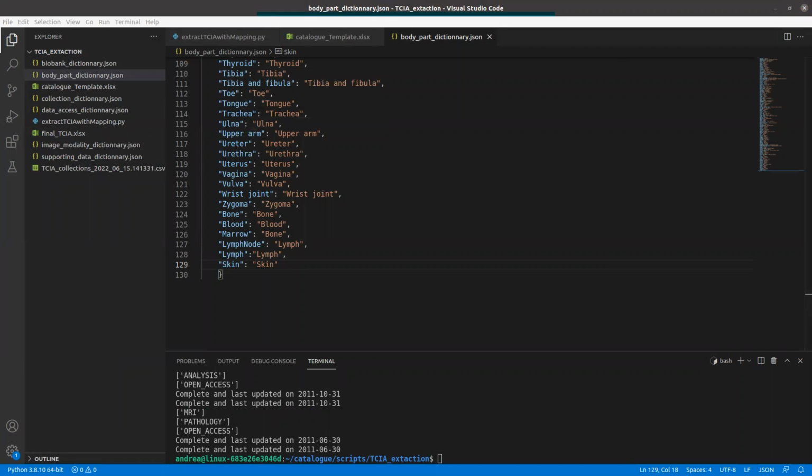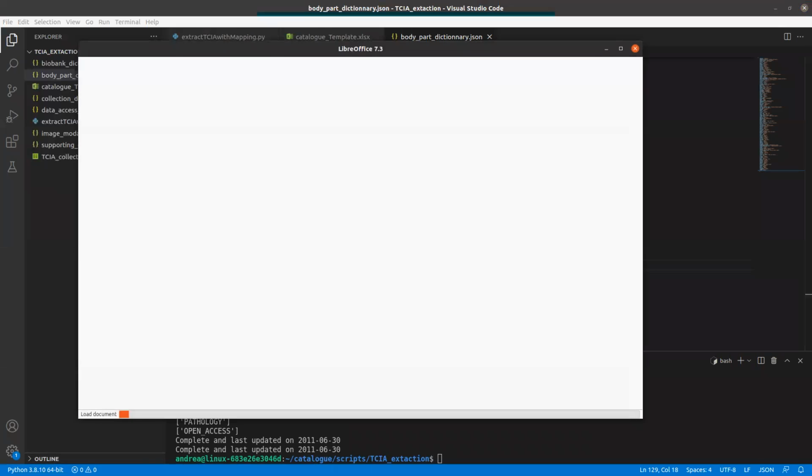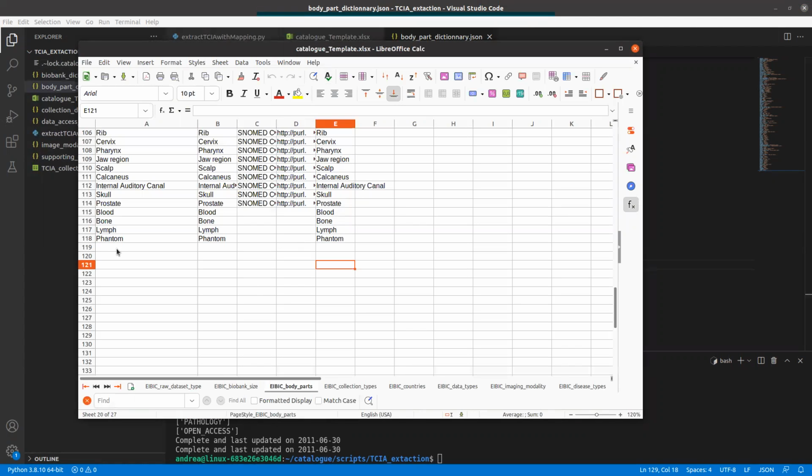What we're going to do is do it the right way, so we're going to redo everything again. That's really good, it's a very good exercise. I deleted the final one because we're going to redo it, and I'm going to open the template. That's the kind of error you will get when the structure of the model is not complete.